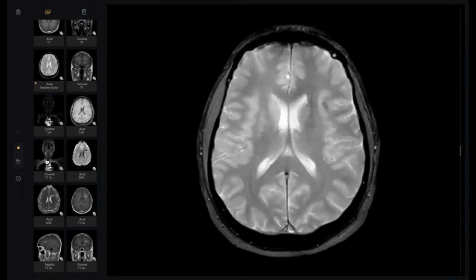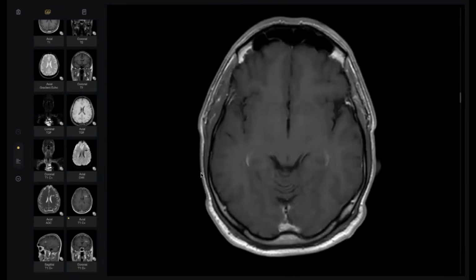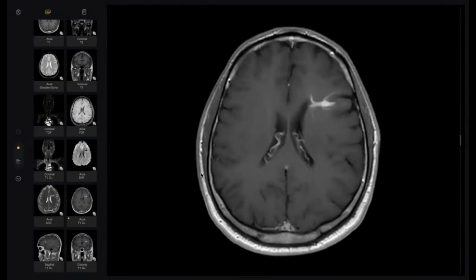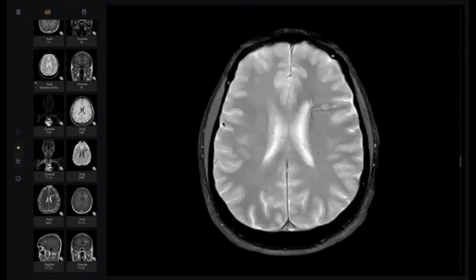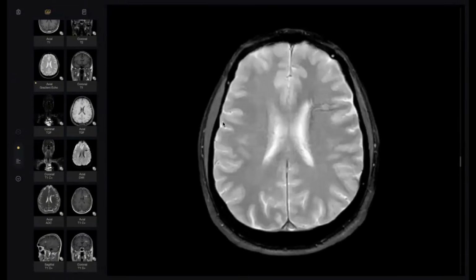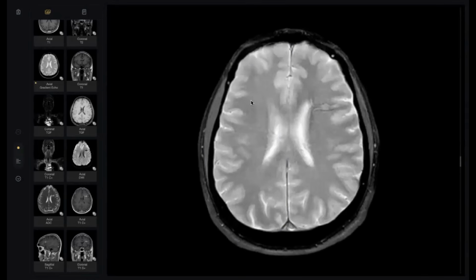The best sequence to see and delineate the deep system is SWI. Okay. Here I will show you something. Here, look. SWI is the best, and SWI is the origin of the venography of the brain. I will show you something here as much as possible in this gradient, but this is not the best. The deep system starts here subcortically.